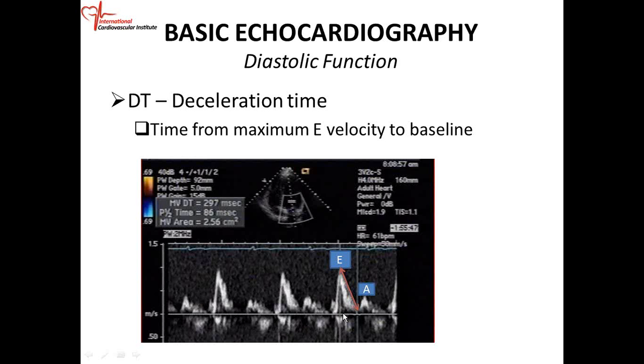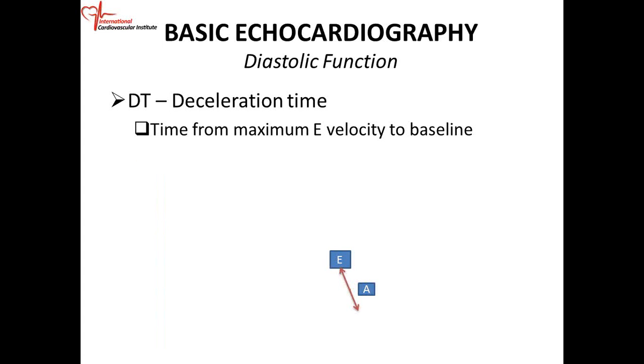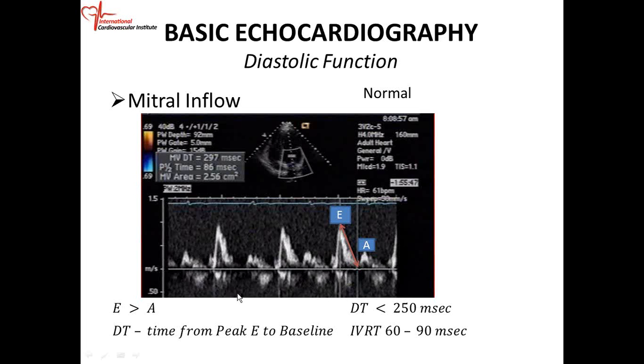Okay? Those parameters make up the diastolic period of the left ventricle. Let's go back here. The normal deceleration time is usually less than 250 milliseconds.